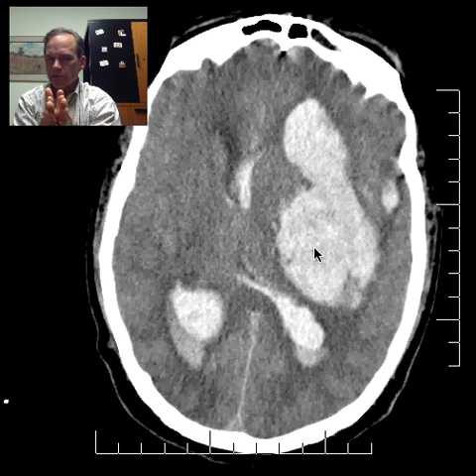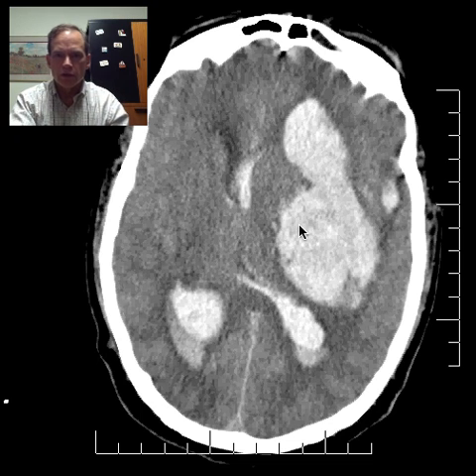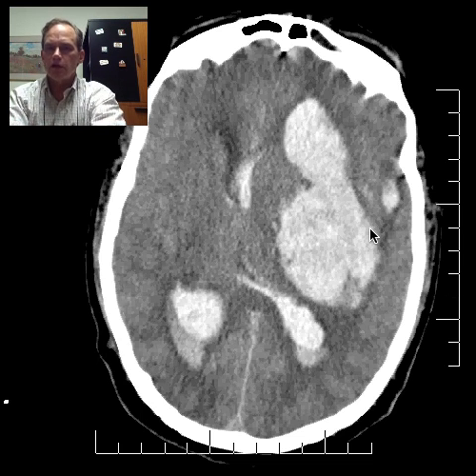These hemorrhages that are hypertensive, that arise from the perforating vessels arising from the MCA, they tend to kind of dissect apart the tissue of the brain. So this tissue here probably would ordinarily join there, and it's just spreading it apart.